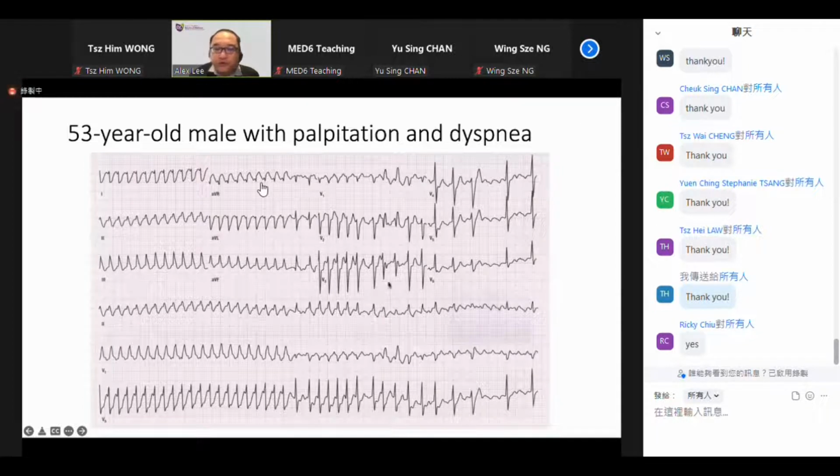So it shows that this patient has a possibly changing conduction through the AV node and the Purkinje system that is rate dependent. And look at this part of the ECG. And this part of the ECG.